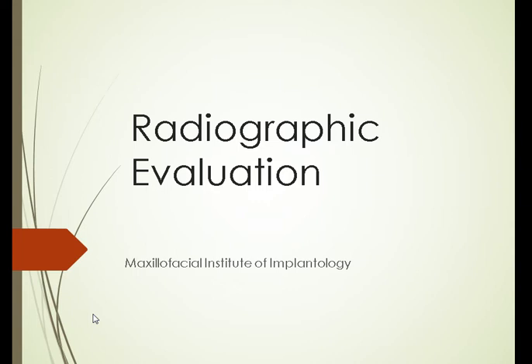It's better to master this because I will use this tool to give us a better understanding of how a three-dimensional object looks like in two dimensions, because in most of our cases we have PAs and a panoramic, and it's hard to visualize 3D images with the 2D images that we get with PA and pan.